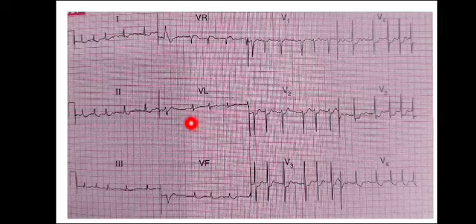In this third ECG, again, first of all, look for the rhythm. You cannot find a proper P wave in lead 2, and if you see the RR complexes, the distance between two RR complexes is different between every RR complex. So along with these fibrillations, this is atrial fibrillation.